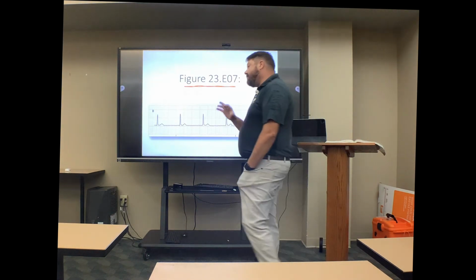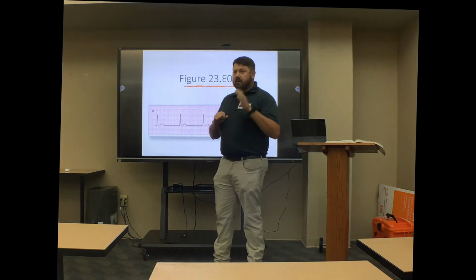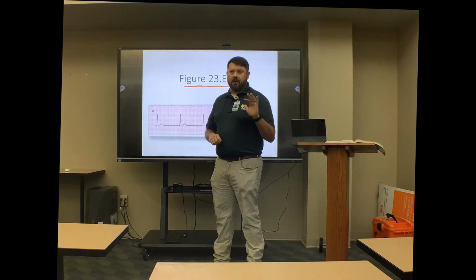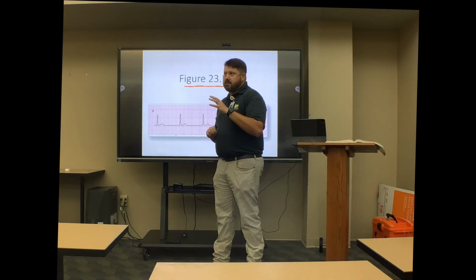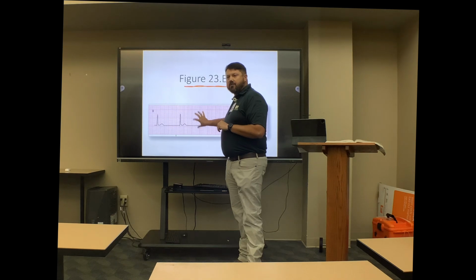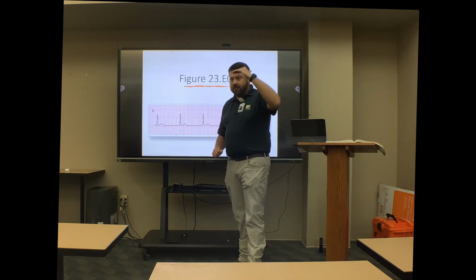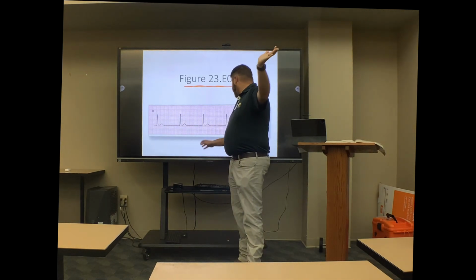So I've always kind of gotten a little confused in textbooks when they say something can very easily be confused with AFib, because if you confuse this with atrial fibrillation, you're not following your system. You're not following your rules correctly, right? Because your rules, your rate, your rhythm, right? Your P wave.